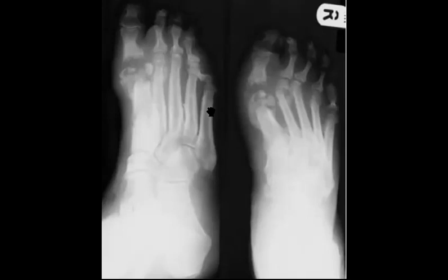The most common cause for Charcot joint is long-standing uncontrolled diabetes. The usual affection is the ankle and the foot. As in this case, you will mention joint changes, but probably joint changes with no trauma.